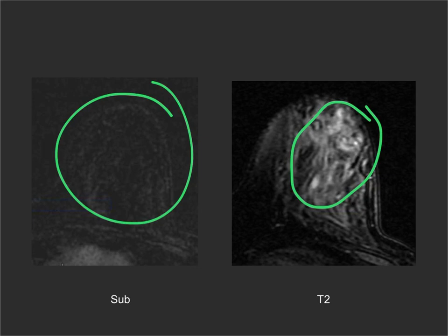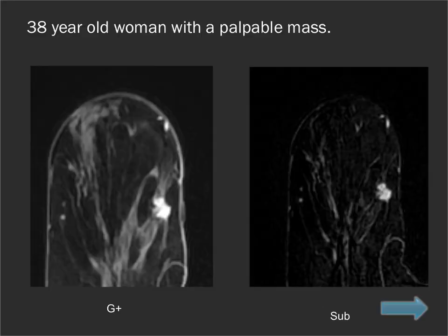It's a little bit high. And this is typical ductal ectasia. The ductal ectasia signal on T1 and T2 is going to vary depending on whether it is proteinaceous fluid or not. So less proteinaceous fluid will tend to be dark on the T1 and bright on the T2, and vice versa for proteinaceous fluid.